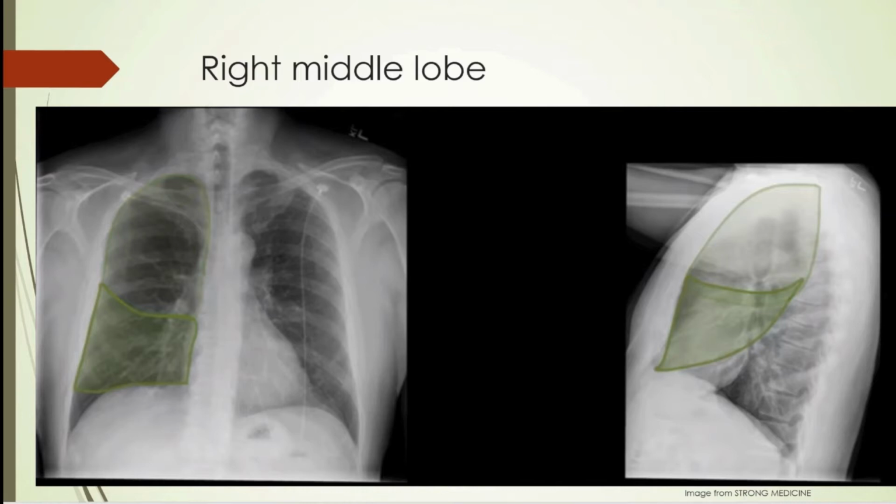And you look on the lateral where the middle lobe lies, and again it lies over that heart right there. So if you get an obscuration, is that a word, of that heart, then it indicates that there's an infiltrate right there.